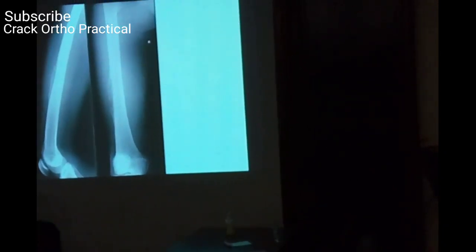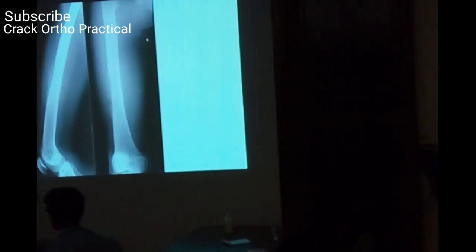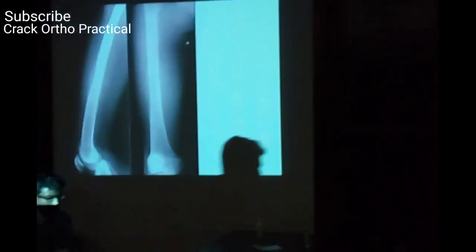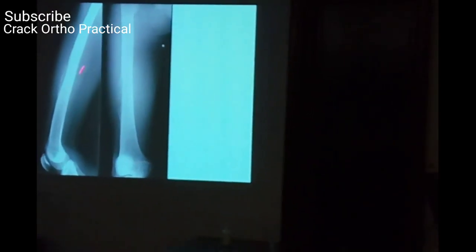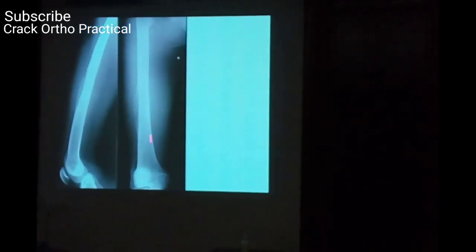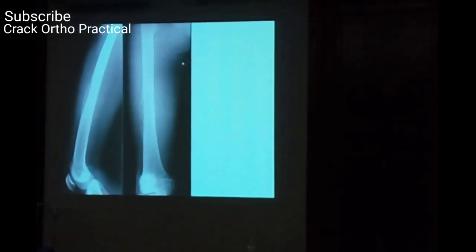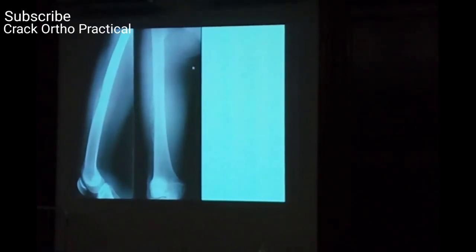But lymphoma, does it go on the surface of a bone like this? What you're seeing is on the surface of the bone, and not much activity inside the medullary cavity, isn't it? In lymphoma I would expect more of a permeative lesion in the medullary cavity than a periosteal nature.